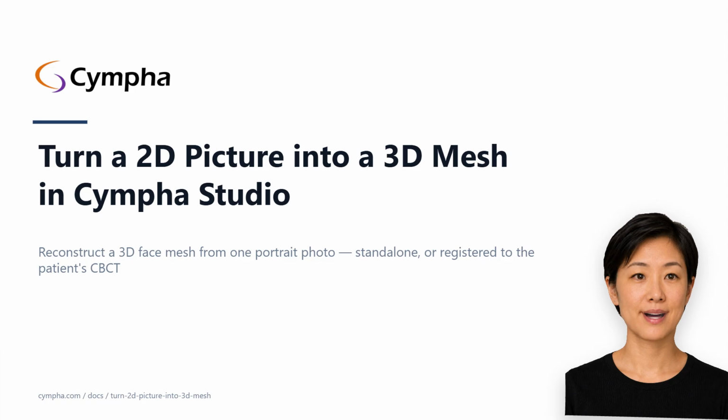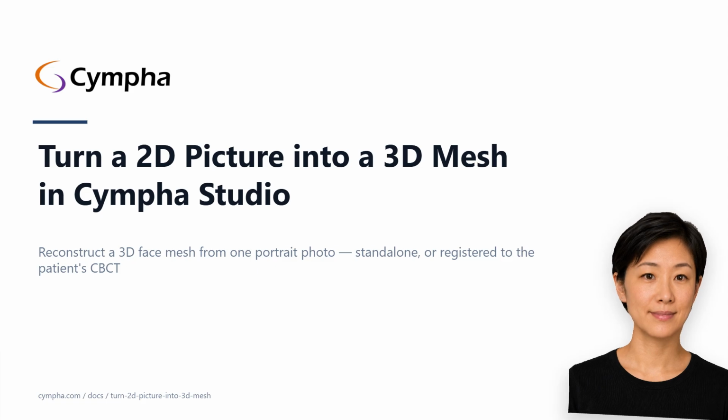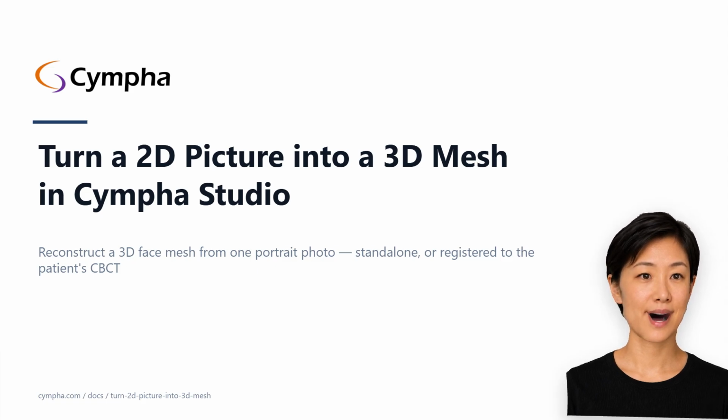Today we're going to talk about turning a two-dimensional picture into a three-dimensional mesh in Cympha Studio, reconstructing a real 3D face from a single portrait photo. This one is for clinicians, case reviewers, and designers who have one front-facing photo of the patient and want it in the scene as actual geometry, either stand-alone or registered to the patient's CBCT so face and bone share one coordinate frame. By the end you'll know which studio action does this, when to take the CBCT-aligned path versus the photo-only path, what the on-screen sliders control, and how the result lands alongside the rest of the case.